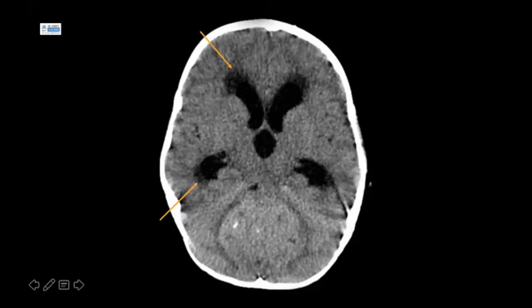This is transependymal edema, and it is a radiological sign of acute hydrocephalus, as CSF is forced out of the ventricular system into the surrounding brain parenchyma. It demonstrates that if there's any pathology in the brain that obstructs the normal flow of CSF, it can result in acute hydrocephalus, which likely in this case would need decompression and a shunt placed.